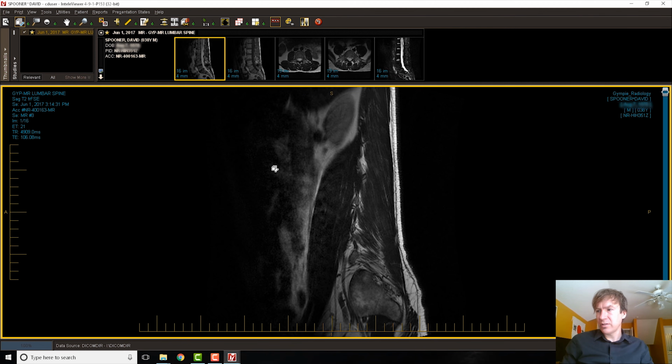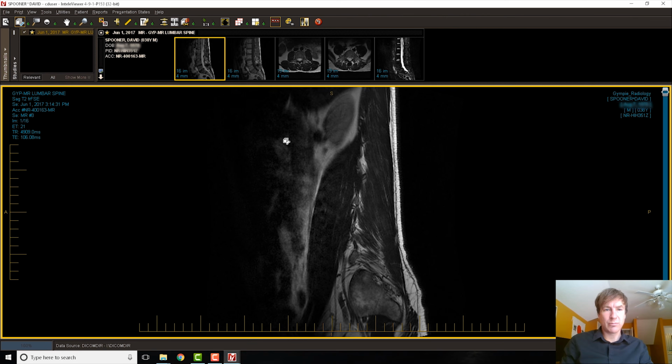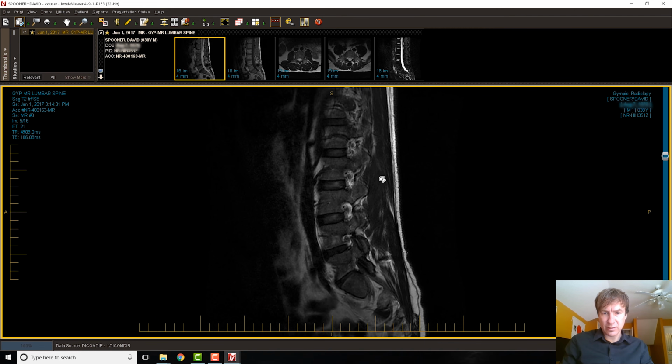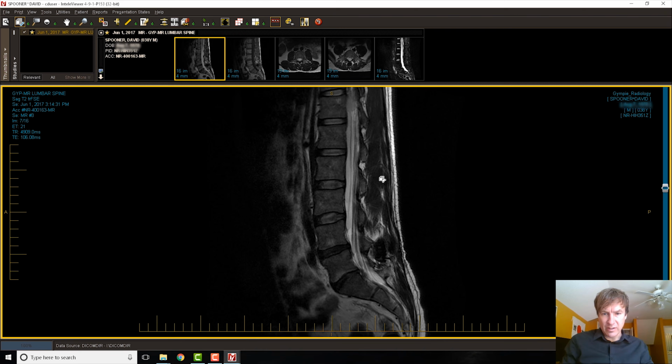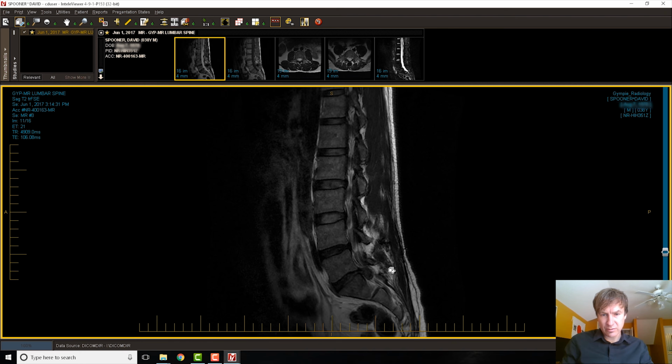Okay, so this was done in June. That last one was done in May. There's a date here, you can see it. This is June 1st, 2017. And the last one was done sometime in May. You can go back and look at the date on it. Anyway, again, I'll just cycle through this fast. If you need to pause it or go back, you're free to do that.